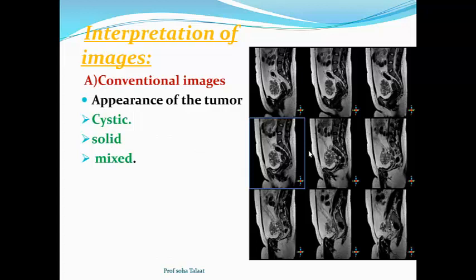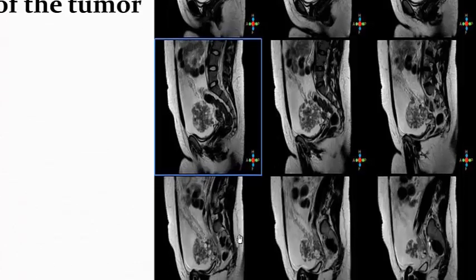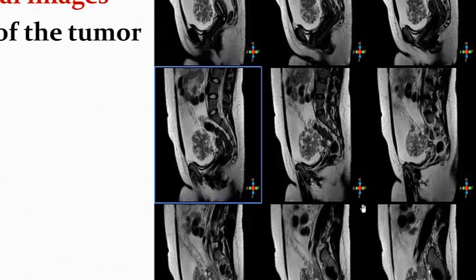So this is an adnexal mass, predominantly solid in nature. The origin, yes, this is the ovary, and it arises exophytic from the surface epithelium of the ovary. It arises here, exophytic from the surface epithelium of the ovary. This is regarding the primary; we know the origin.